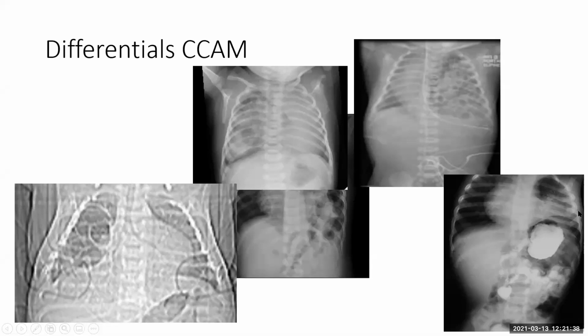This is eventration, which is another differential of such cases, right? There is displacement towards the other side. We can see the diaphragm. Over here, we could see the diaphragm.